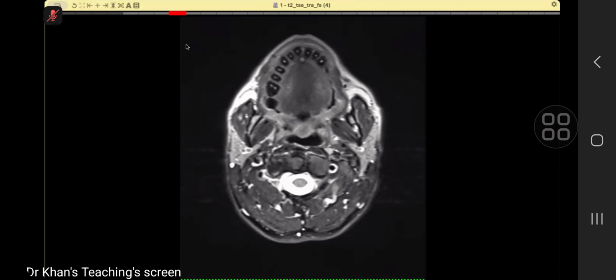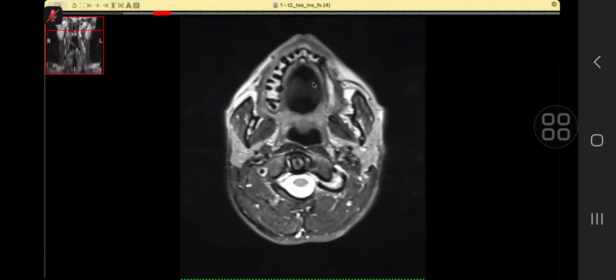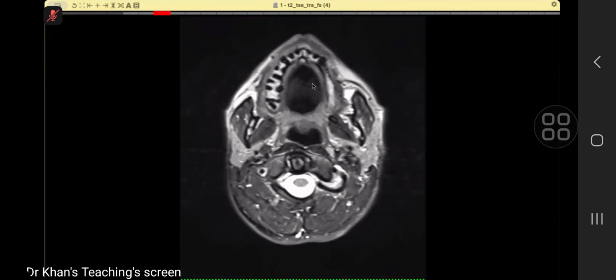Okay, over to you. Okay, in this, I assume this is a single slice image. No, you can scroll it. Okay, I was finding difficulty. However, I could see pathology in this image. Sir, I can again request a remote control. I have again put the request. Okay, it is with you.